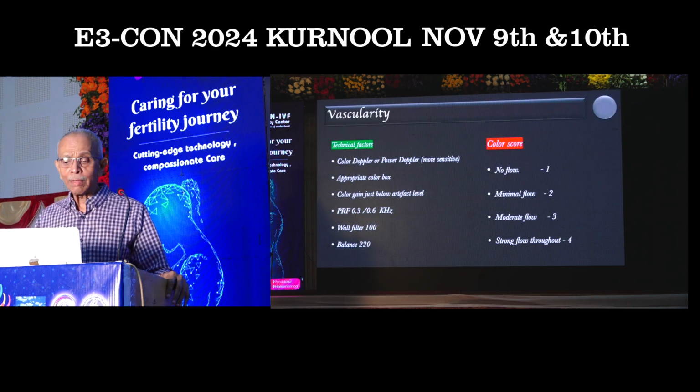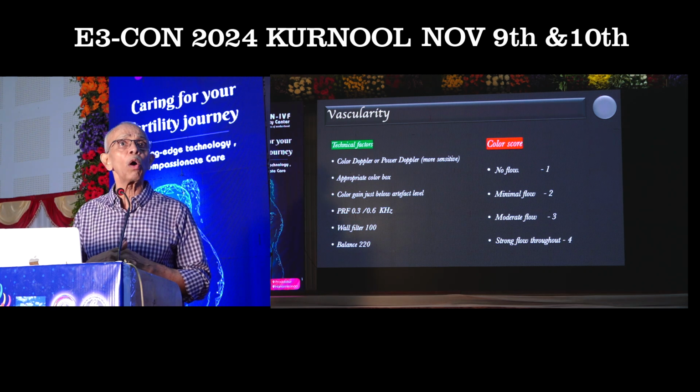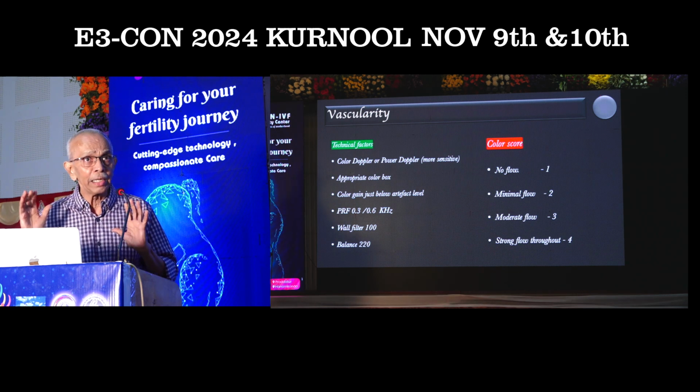Then comes the vascularity. Vascularity is extremely important, as I'm sure you all will agree with me. Whenever there is increased vascularity, our minds will immediately think in terms of a possible malignant lesion, isn't it?